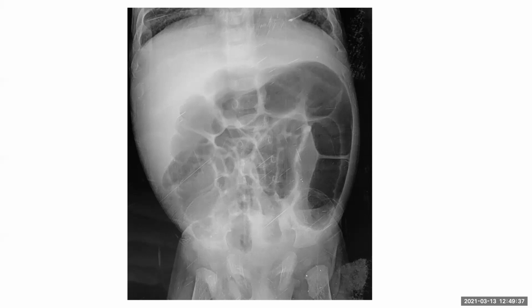What further imaging would you do to rule out the cause? If you are suspicious of a right inguinal hernia, what do you think would help you in the department? Yes, an ultrasound scan can be done, as this is a neonate. So that can be performed of the right inguinal region to confirm my findings.